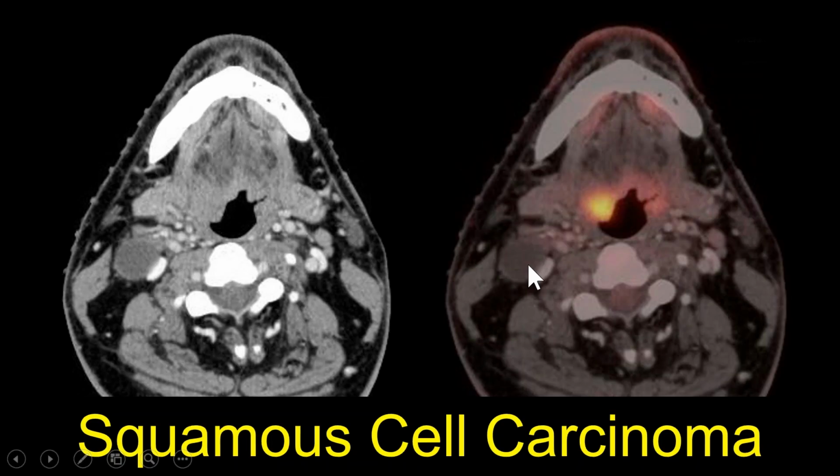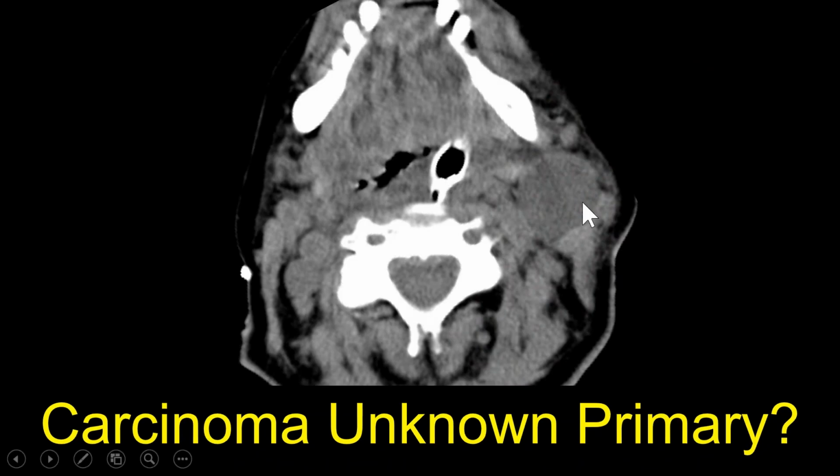So that's a good appearance for an oropharyngeal squamous cell carcinoma, especially HPV, that may have big cystic or necrotic looking nodes there. Anytime we see a cystic mass of the angle of the mandible, we think about an HPV positive squamous cell carcinoma. So this is a patient who came in with a big cystic area, and we thought the same thing. We thought this is probably a squamous cell carcinoma node, and they really wanted us to stick a needle in it to see.